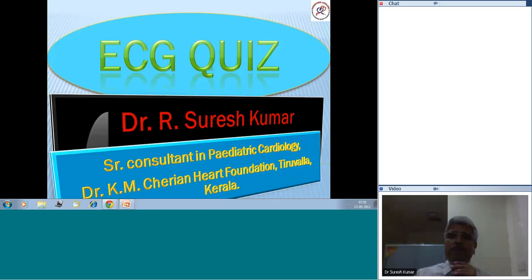This is a quiz session which is to familiarize you with some of the ECGs which I'm sure many of you have seen. The idea is to show you those ECGs, make you think, give you a diagnosis after that, and then discuss related issues. That's what we are going to do now.